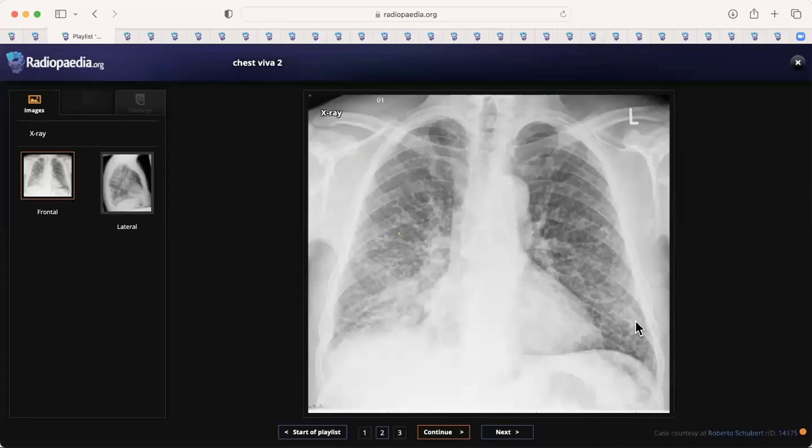Okay, well done. So this is a case of miliary nodules. You commented that there are multiple reticular opacities. It looks reticular, but when you have another look, there are some randomly distributed nodules. You've correctly said that there is no lymphadenopathy, and there is this patchy airspace opacity here. That's a pointer towards a specific diagnosis. If I were to tell you to choose one diagnosis, what would you go for? I will go for TB. Yes, this is a case of miliary TB.